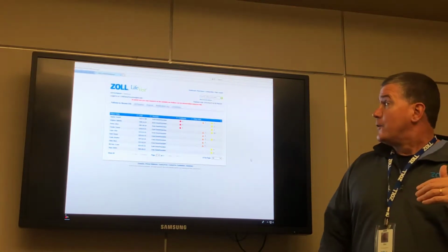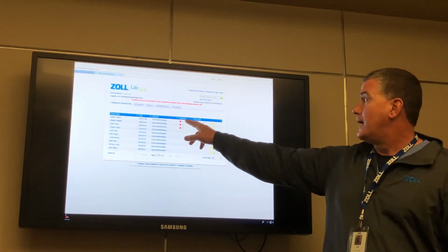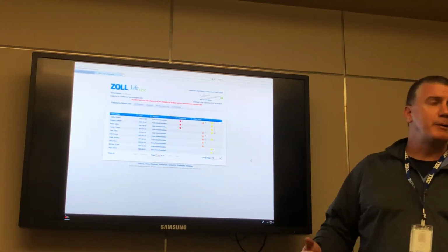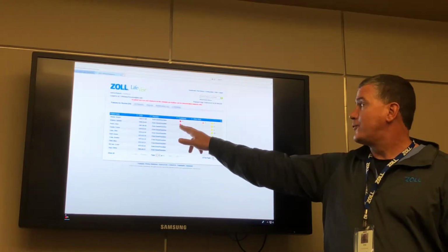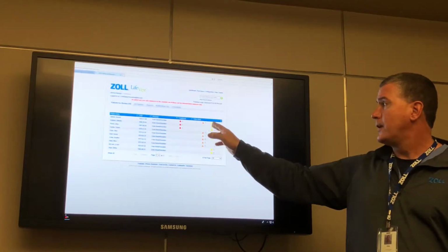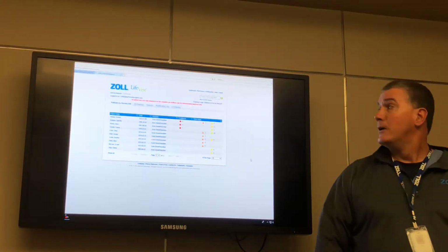Okay. So what you see here is the patient's names, and then these are called alerts. The first thing is patients for review. So on this page, we have 10 patients that need to be reviewed. You have some patients that have been treated. You have orange alerts and yellow alerts. It's color-coded. Yellow is the least important. Orange may be more important, and obviously, for patients that have been treated, you definitely want to see that.